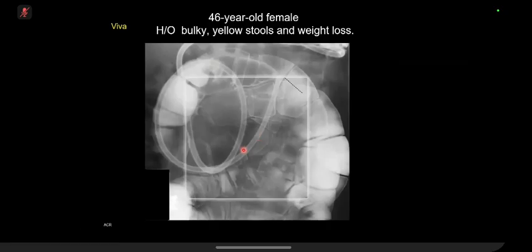So I'm presented with a spot film of small bowel enterocolysis with a catheter seen in situ. This, as you told, is in the jejunum. The striking abnormality that I can see is that the jejunal folds are not what we expect to see. So there seem to be fewer valvulae conniventes.